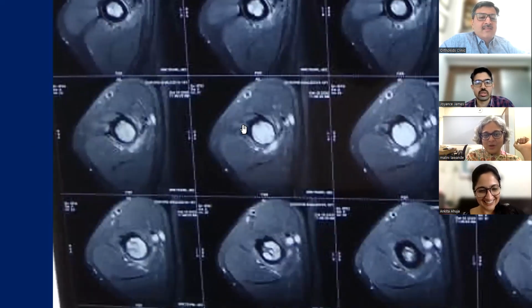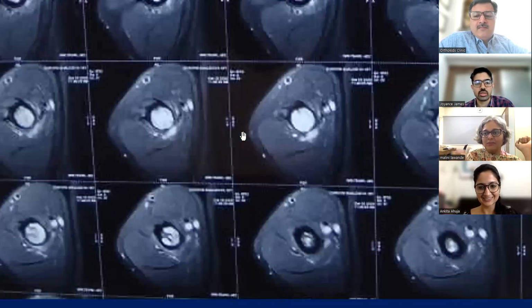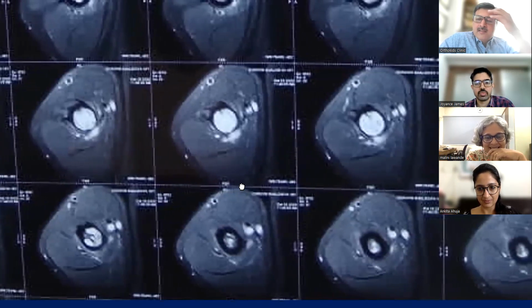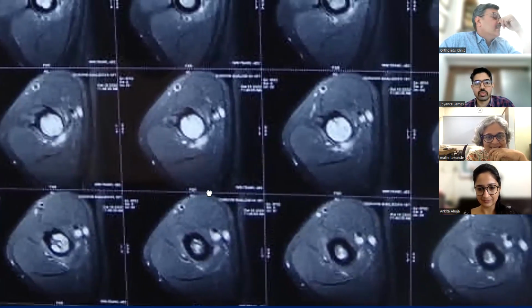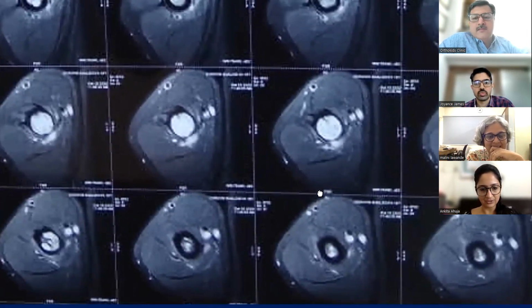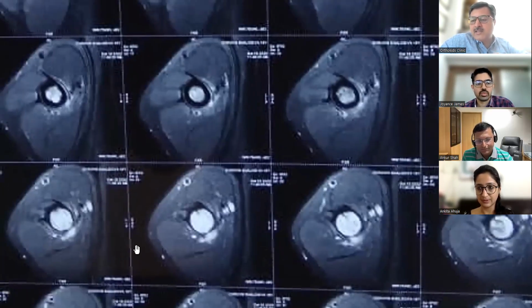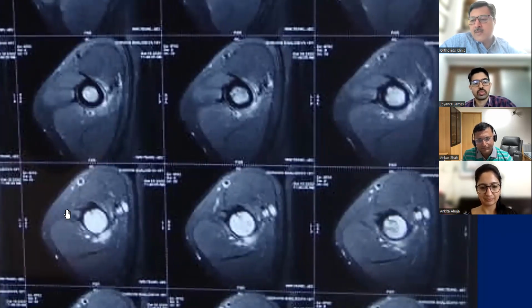So this looks all bright, but on windowing, there could be blood fluid levels. In a nutshell, there is soft tissue edema as well, again could be because of the fracture. In a nutshell, we all were confused that this is not a typical thing. And so the next step was to involve Mandeep and to take a biopsy.